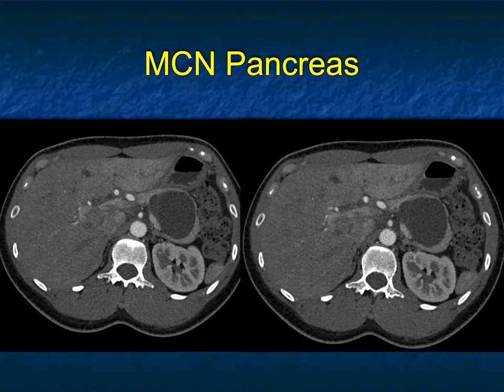So what do you got? You got an MCN. Again, good location. Patient was in their 40s, hopefully, more likely a female. But a cystic neuroendocrine tumor would be a good bet. MCNs are considered malignant or pre-malignant, and they'll always be resected.